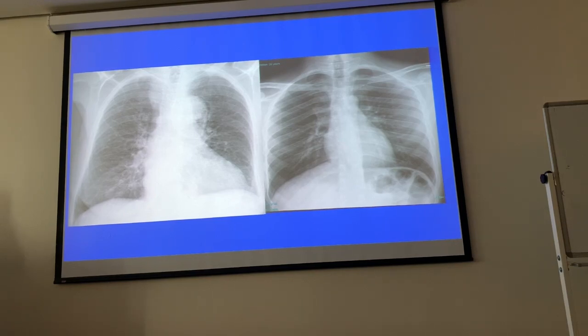So this is actually a patient who is known to have chronic bronchitis. But just by X-ray, you cannot say that this patient is having chronic bronchitis. And if you look at the heart also, it is a little bit toward the biggish side. It's not big, but.